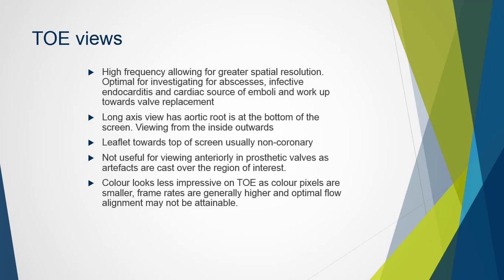Transesophageal work is advantageous when assessing for aortic regurgitation, as we use high frequencies that allow for greater spatial resolution. The important thing to note is it's not always useful when viewing anteriorly with prosthetic valves. Artifacts are often cast over the region of interest, and this may be important if we have dehiscence or paravalvular regurgitation.